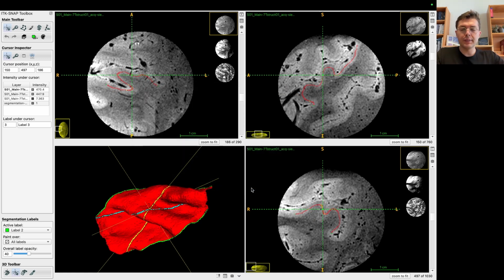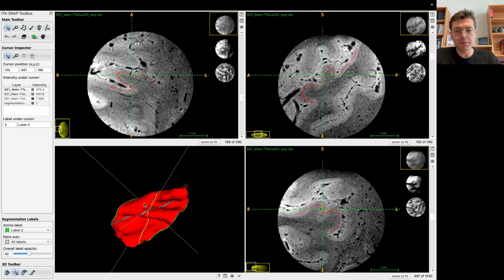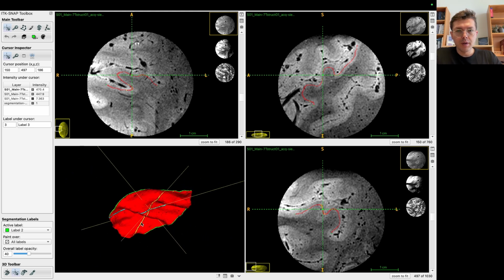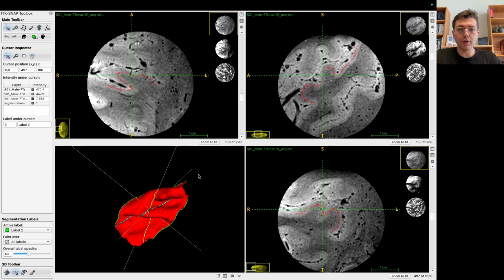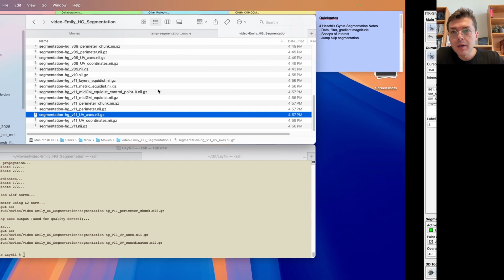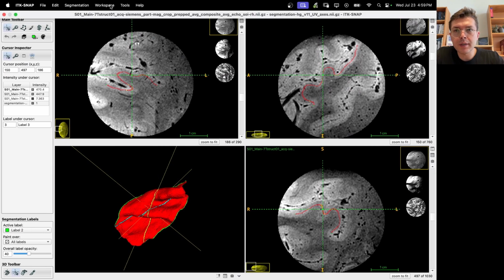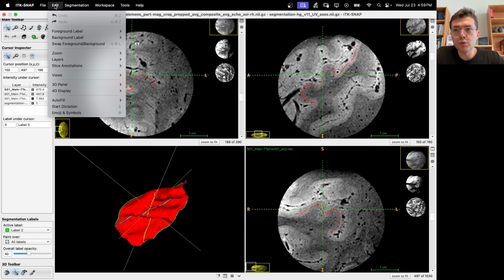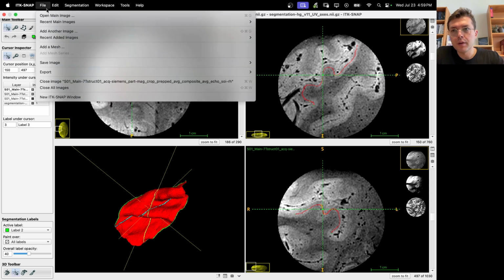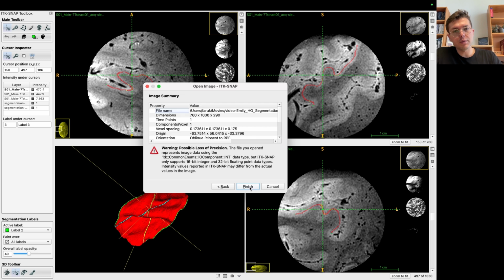Normally, I would have segmented a bit larger, but I tried to be more efficient for this video, and of course it broke down. Okay, so see, our axes are not exactly orthogonal, and this is probably because the perimeter was just barely inside the region that we segmented, which means that we need to do a better job here. Okay, let's repeat the process. This is just iteration. You iterate 2-3 times, it will get there.